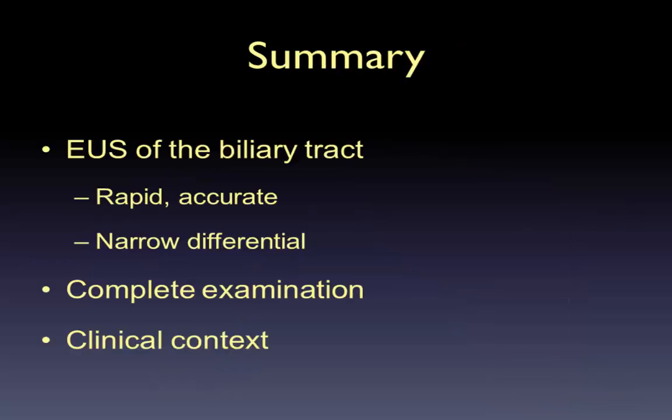department. So just to summarize, emergency ultrasound of the biliary tract is incredibly helpful. It's fast, it's accurate, can help you narrow your differential, make a diagnosis right at the bedside, or pursue other diagnoses if it's looking negative. Always make sure you look for your normal landmarks, do a complete exam of the fundus, the body, and the neck, and as with all ultrasound, interpret everything in the wider clinical context.